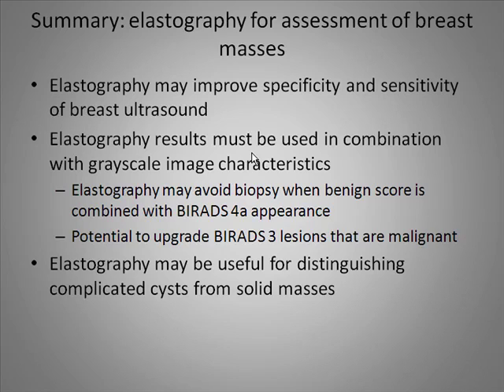In addition, elastography has the potential to take lesions that we already follow, BI-RADS 3 lesions that have a less than 2% chance of being malignant, and possibly elastography can find that 2% that are malignant and upgrade them to biopsy. In addition, elastography may be useful in distinguishing the increasing problem that we have with non-simple cysts appearing as hypoechoic masses. If elastography can pick out the masses that are actually complicated cysts from the solid masses, that will spare a lot of intervention.